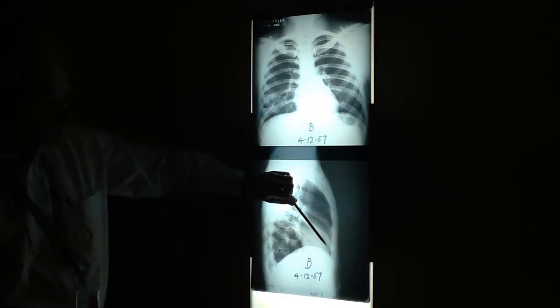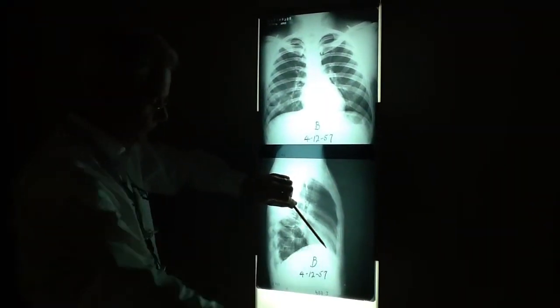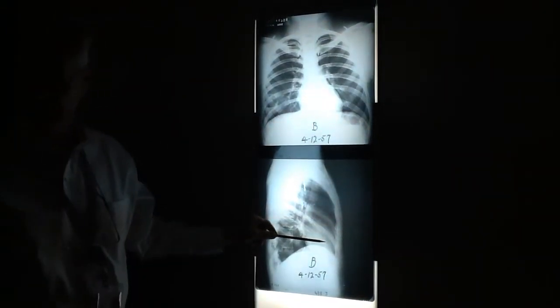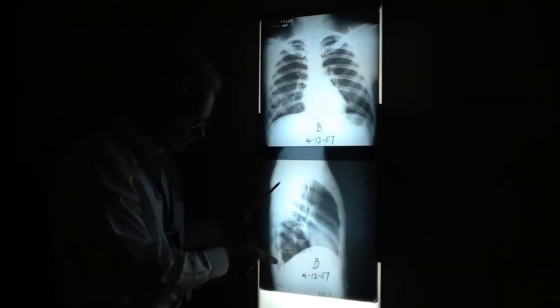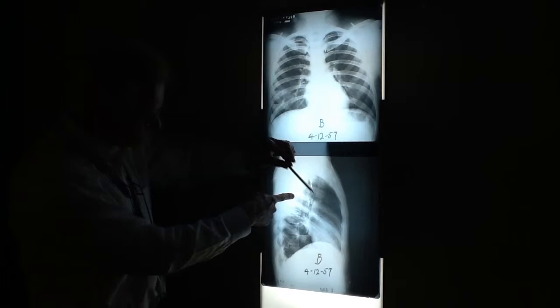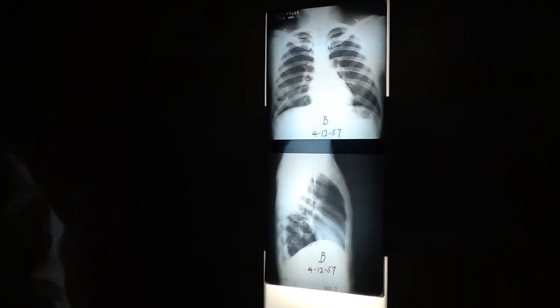Major fissure? Somewhere in here is going to be the major fissure. So definitely not 4, is it? So no 4, yes 8, probably not 9, because 9's back here. Why not 6? Too low. With the major fissure in, 6 is up here. So no on 4, yes on 8, probably not 9. Yeah, I like anterior basal.